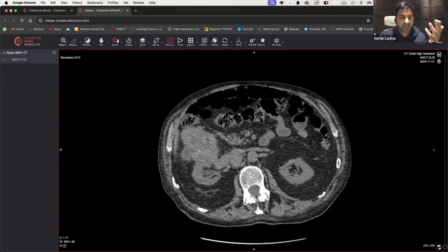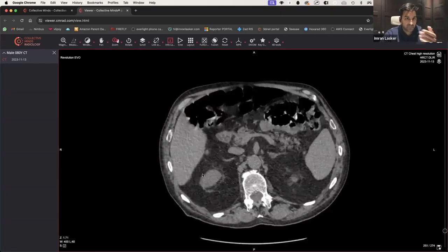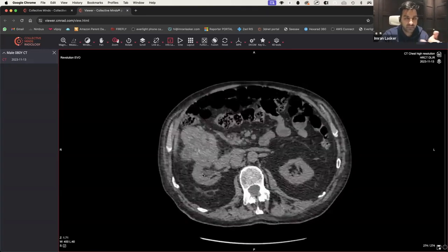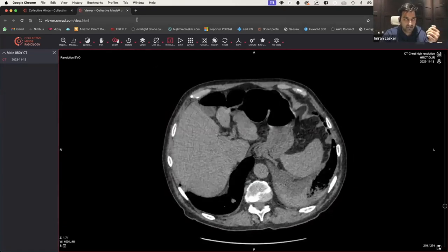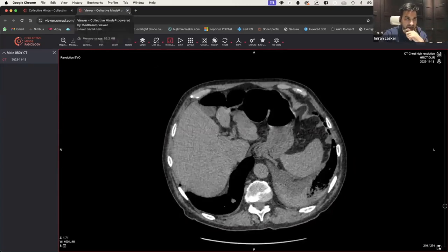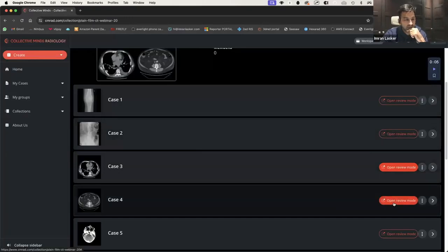And so you can see why it's very, very important that in radiology anyway, I guess anyone who is doing any sort of imaging, you really have to look at every little thing, because this person actually, from what I remember, came in with a non-contrast study because they thought it was a non-healing infection or something. So that's why they did this, and it turned out it was actually the RCC that was probably causing most of the problems. Right. So yeah, well done.